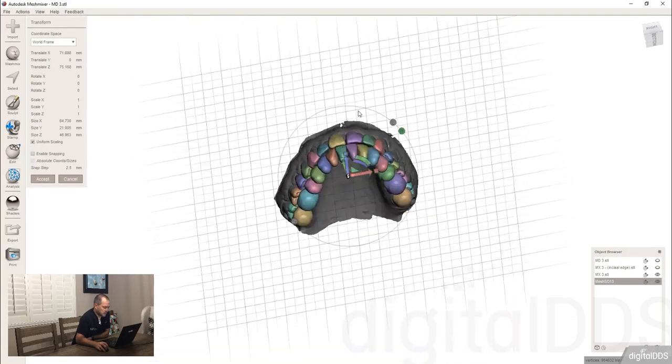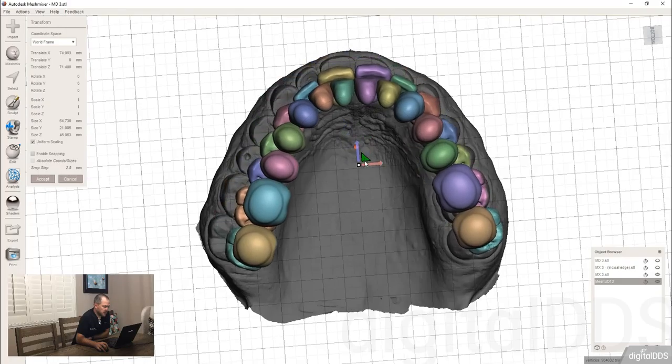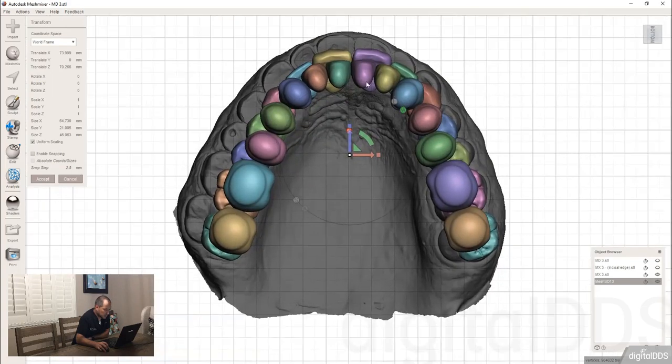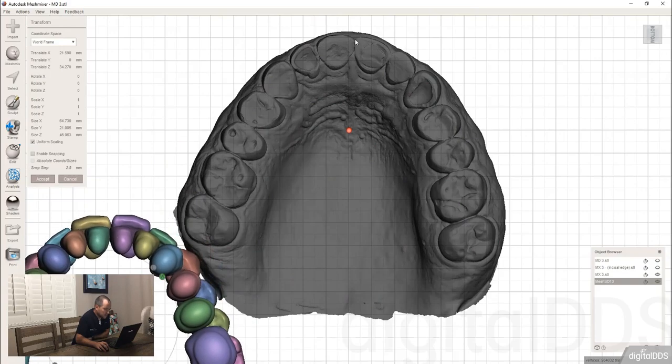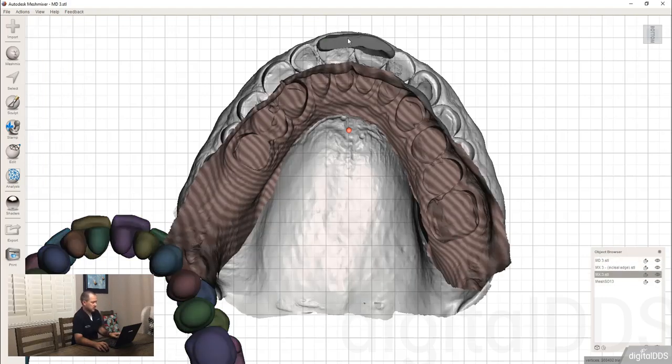All right, so the reason I got rid of the mandibular arch is because it would just be in my way. So I'm looking right here at this midline. Let me align this way. Let me move this out of the way for a second and see how well I'm aligned to this grid. So here's my midline, my anterior teeth, my laterals. You can see that it actually doesn't follow the grid that well, like this molar here versus this molar here. So maybe what would make sense would be to hit accept, to accept that, and to turn these on, okay?